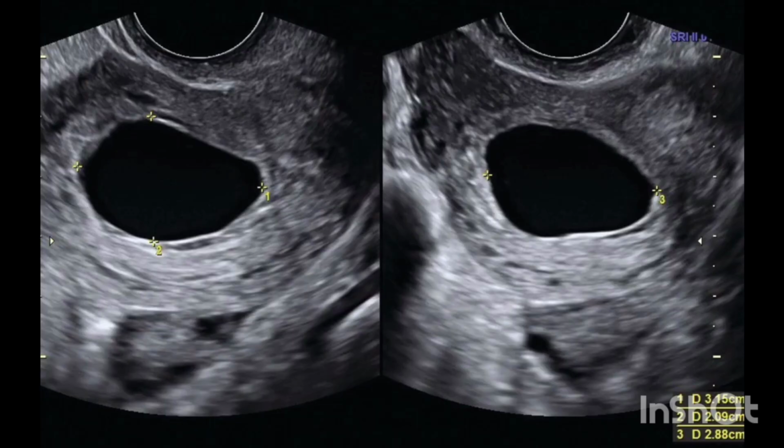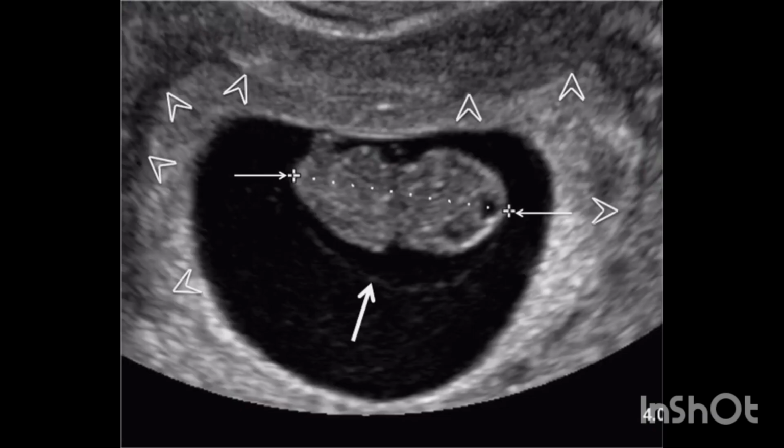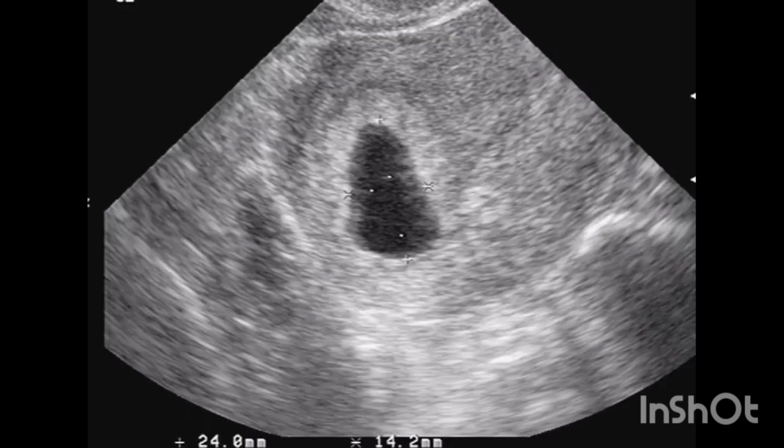Ultrasound diagnosis of miscarriage should only be considered when either a mean gestation sac diameter is greater than or equal to 25 mm, with no obvious yolk sac, or a fetal pole with a crown rump length of greater than or equal to 7 mm, without evidence of fetal cardiac activity. Transvaginal ultrasound is the mainstay in the diagnosis of miscarriage.